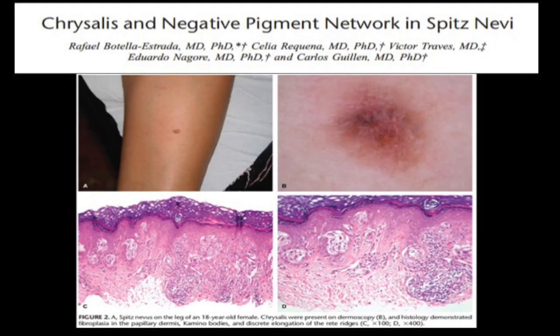What do they correspond to? They correspond to altered stroma, and in fact, newly laid down collagen, okay? And it turns out that very early melanoma progression requires collagen scaffolding, new collagen to be laid down, for melanoma to grow. Hence the presence of crystalline usually means that it's an invasive melanoma, or at least a melanoma on its way to becoming an invasive melanoma. And it correlates also with thicker melanomas.